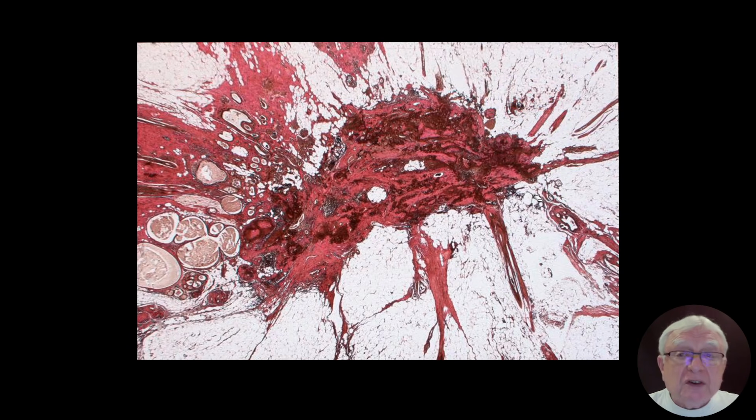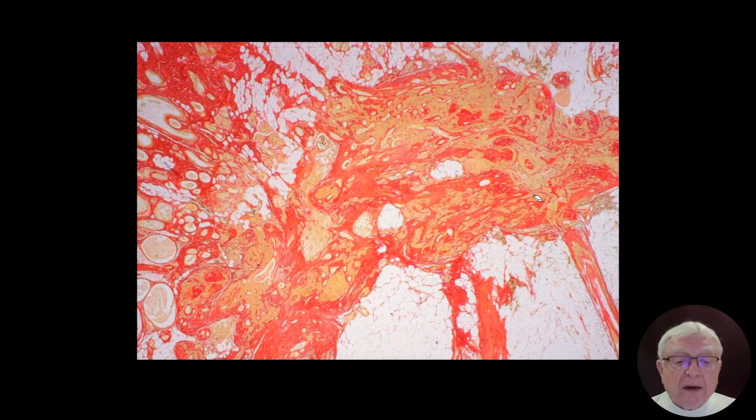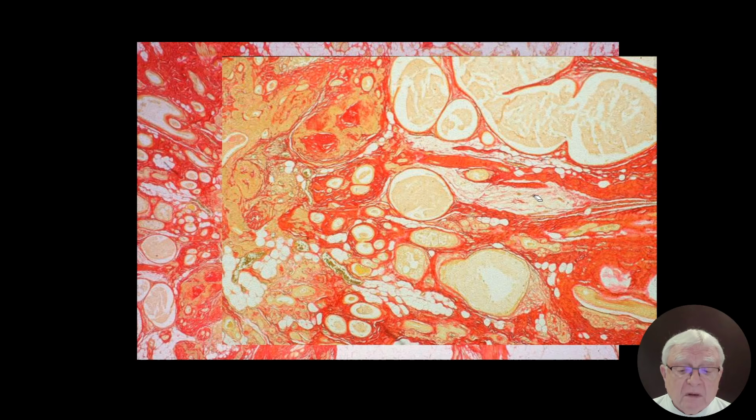Totally hyalinized. Dear colleagues, that's why I'm showing you so many cases, not because, oh, here is another case. Every single case is different. This is elastic staining. There are no epithelial cells left. This is a burnout radial scar. All these different staining methods support this statement. Used to be some hyperplasia, not much left.